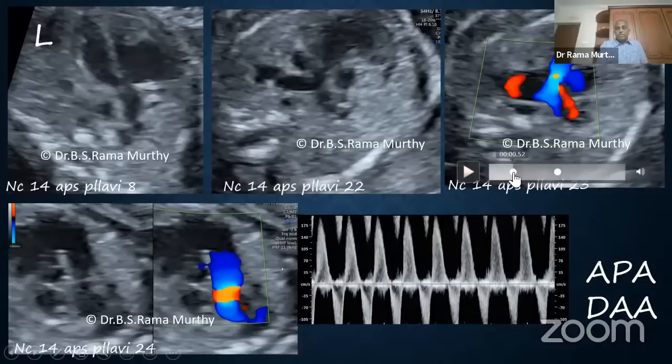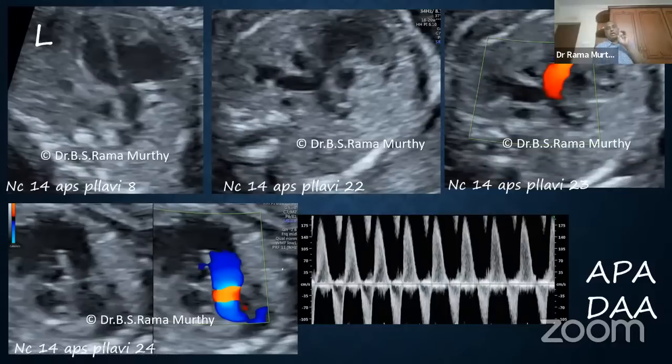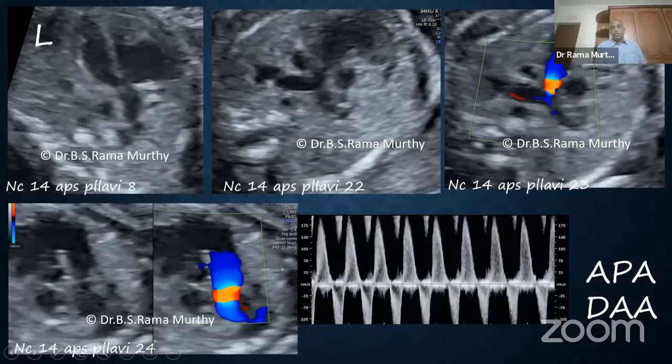But also when you see another phase, that's the diastolic phase, you find that there's a regurgitation. So therefore, this pulmonary valve is as good as useless. A valve is meant to regulate flow in one single direction, right? But here that valve is not doing its work because there's a to and fro.